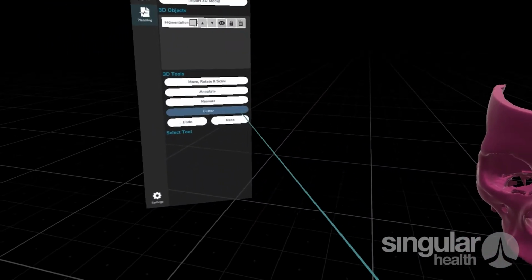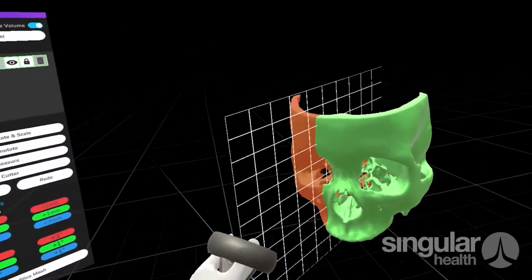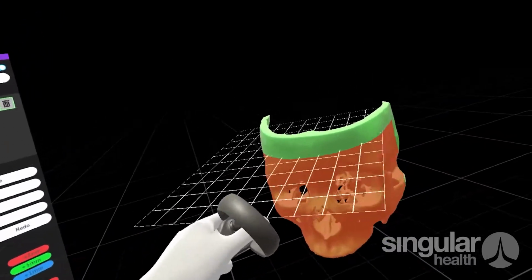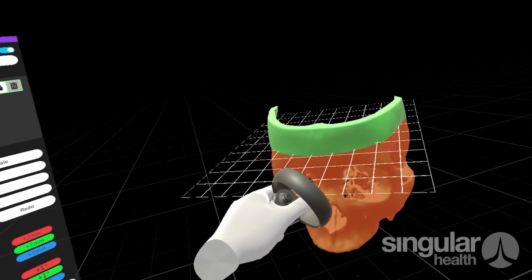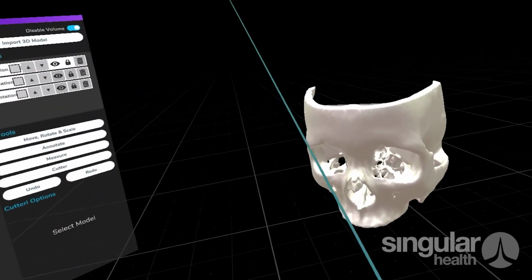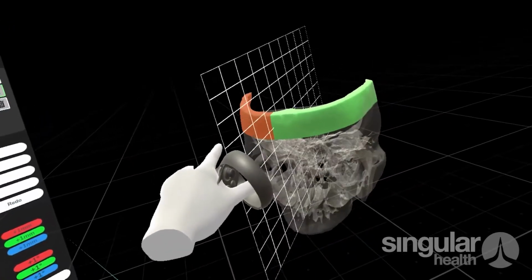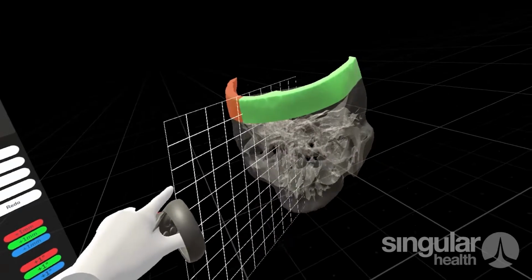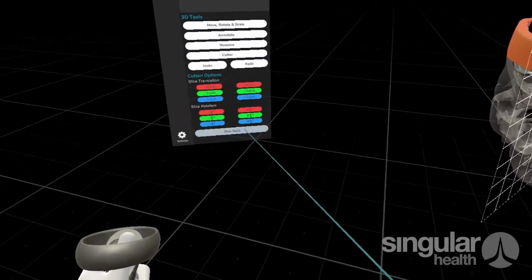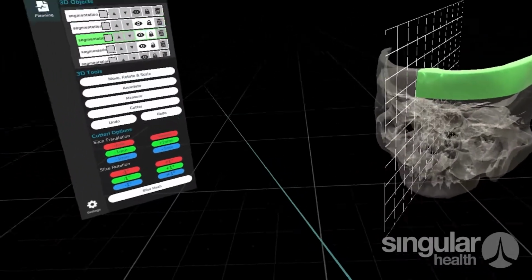So finally we have the cutting tool. The cutting tool lets us slice a mesh. Everything is done locally in this system, so nothing is sent online or sent abroad. For this purpose we'll do a pretty extreme cut. Let's say we'll just cut directly down here. And we'll give it a slice. As you can see, now it's been sliced, and we get a really nice representation of the current object that is being sliced, and everything else is just sort of faded and hidden away whilst it's being used. And if we want to do another slice, we'll do another one. There we go. And you can basically now see we've got several components that have all been sliced up.